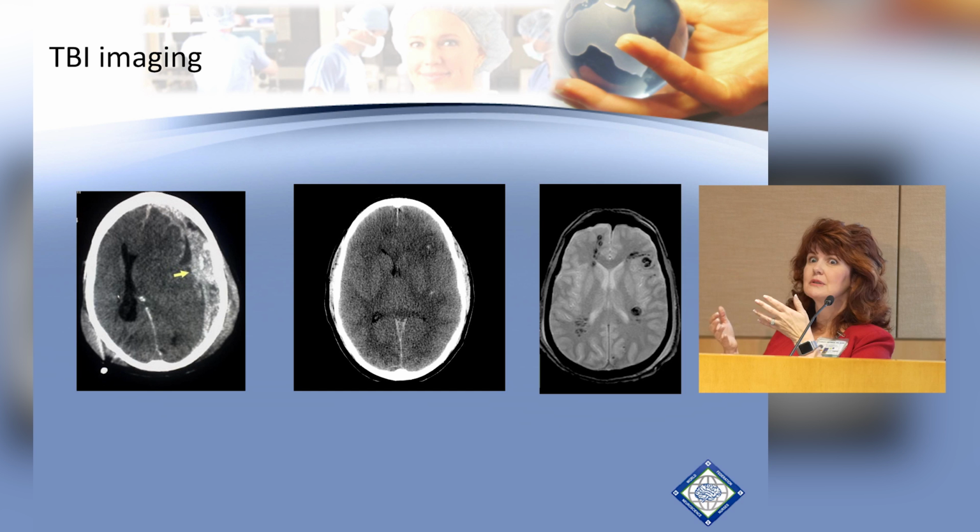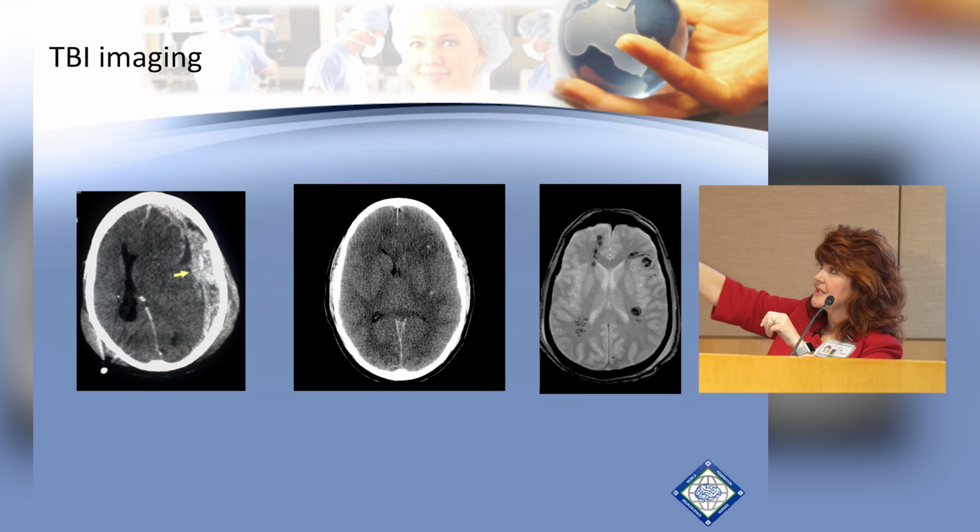But in fact, they can be really impaired, particularly if it's bilateral, because remember, you're actually tearing the connections between the neurons. So it's an axonal injury. It's tearing it. And so those connections may or may not come back. And then on MR, you're actually seeing diffuse axonal injury. It's the same type of injury, but it's so much more obvious, right, on an MRI.